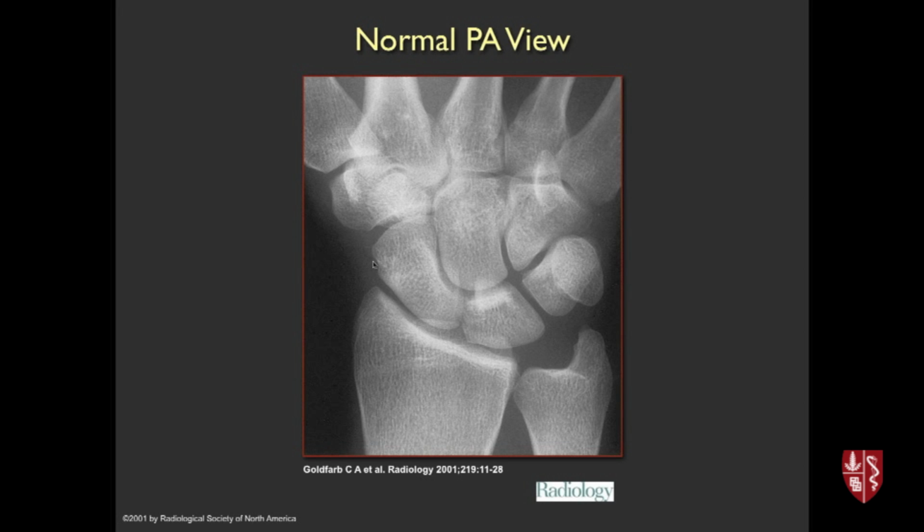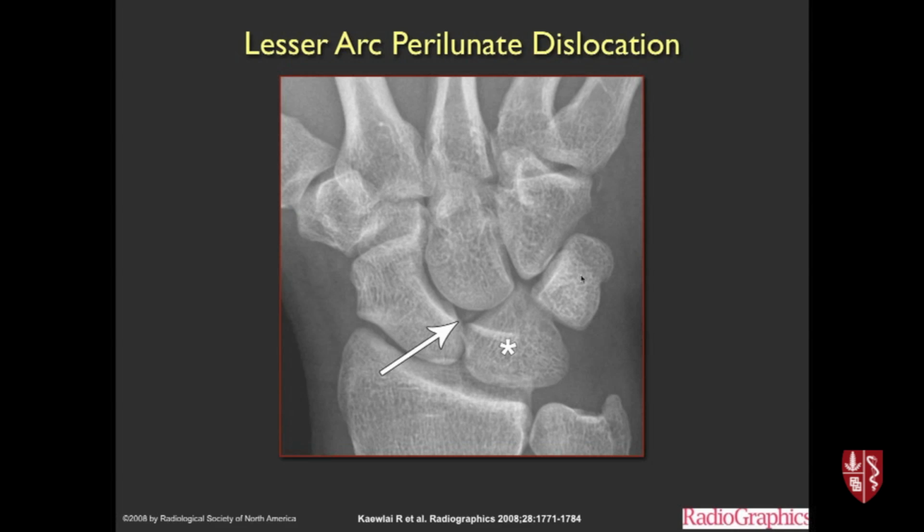So in real life, here's a nice example, scaphoid lunate cruising along to the triquetrum here. That's the first arc. The second arc would be along here, and then the third arc would just be along the proximal aspect of this distal row. Nice normal alignment. And so here's one where that alignment is disrupted. The first arc comes along scaphoid, lunate, and then there's not really a nice smooth continuity between lunate and triquetrum here. The principal abnormality in this patient, though, is in the second arc: scaphoid, lunate, and then this juts out abnormally. So that's disruption of that second arc.